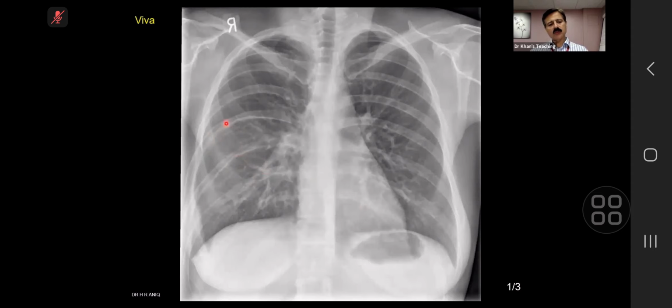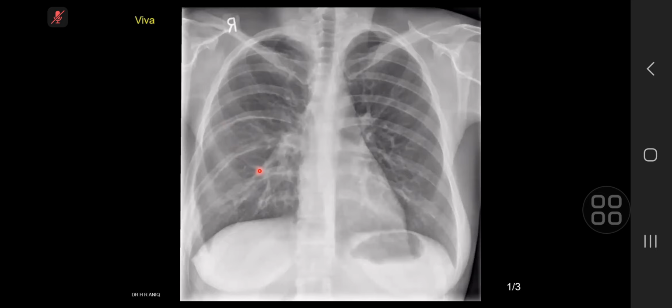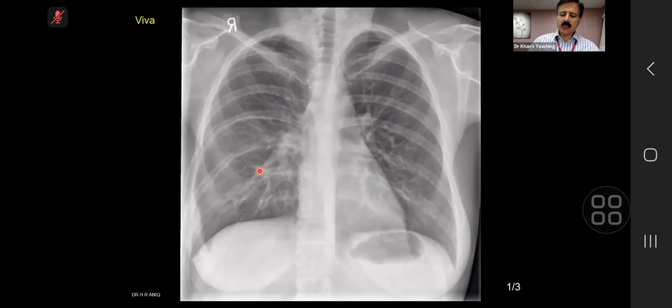What is your conclusion with these ribs? And they look actually quite widely spaced compared to the adjacent ribs either side. Very good. I think there might be a sort of chest wall mass that's splaying the ribs and causing some reactive sclerosis. So I am going into a differential diagnosis from your chest wall, which is classical for your exam. And this is what? Heading of the differential? Rib splaying? Inferior rib notching.